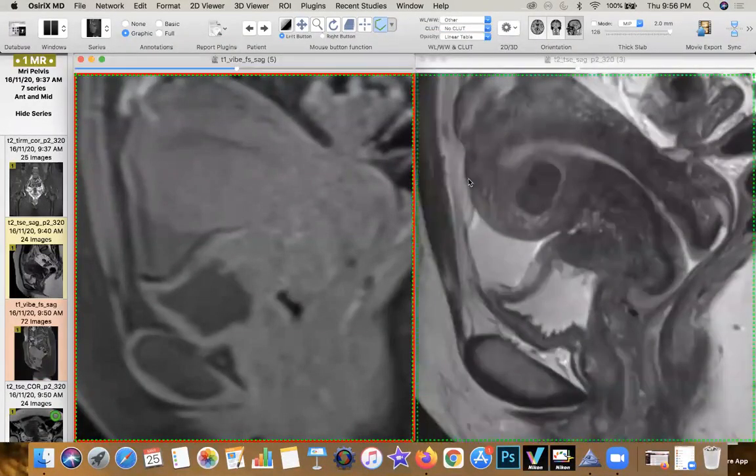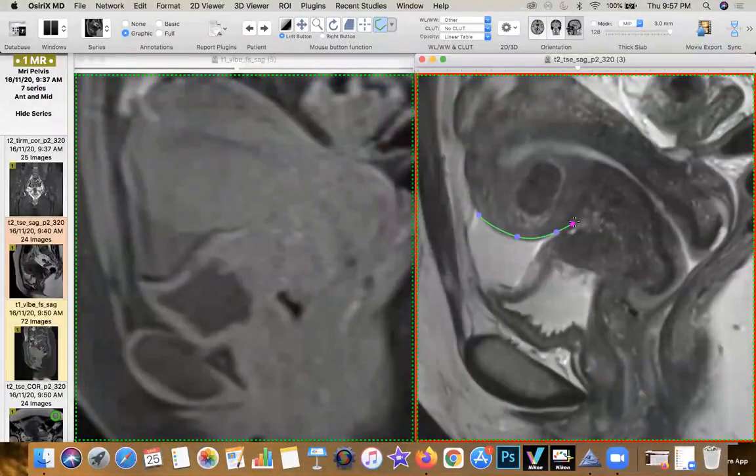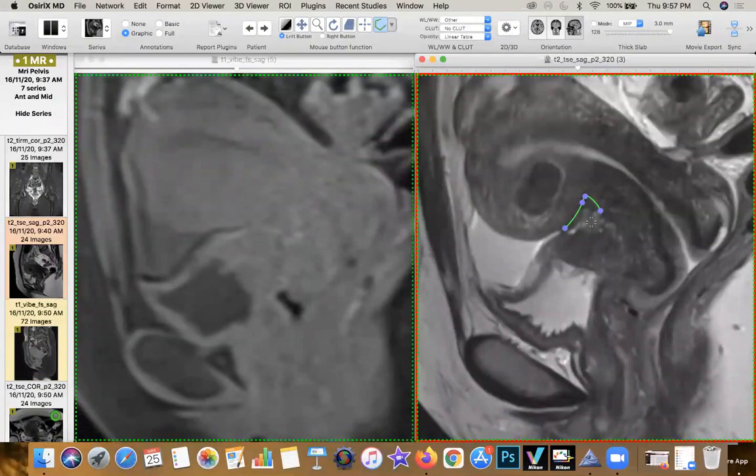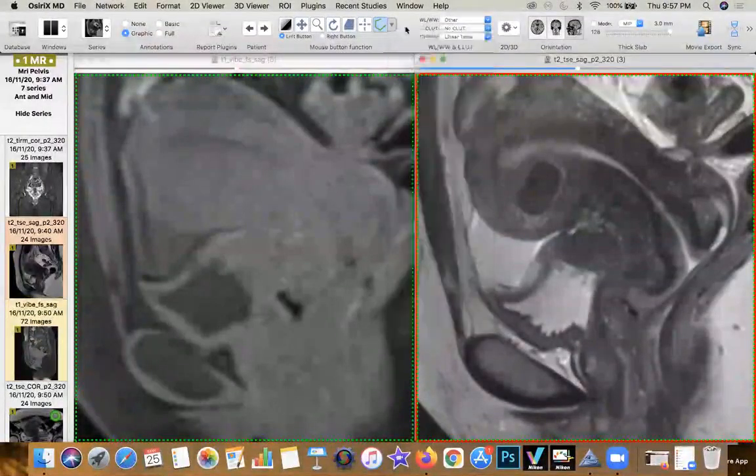This is how the contouring should be. It should go in and come in like this. That should be the normal contouring. What's happened in this case is there's an acute upward tractioning of the tissue, simply because there is thickening, which is seen at these sites.